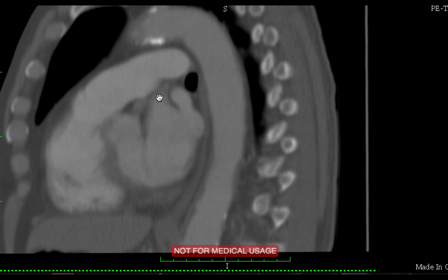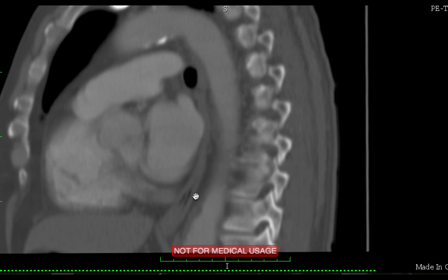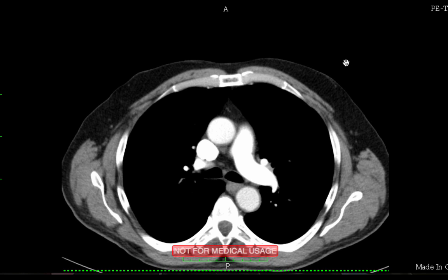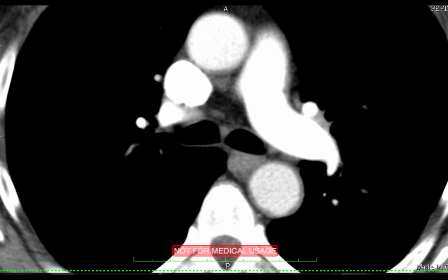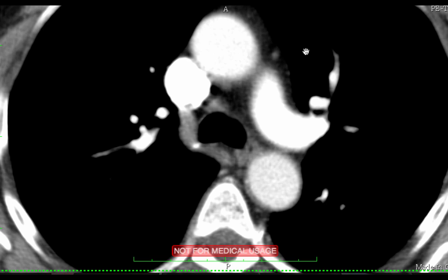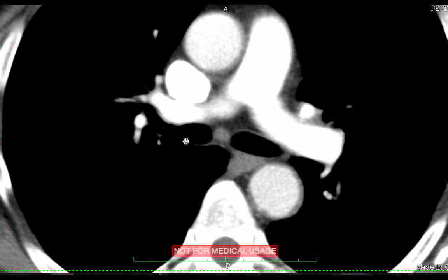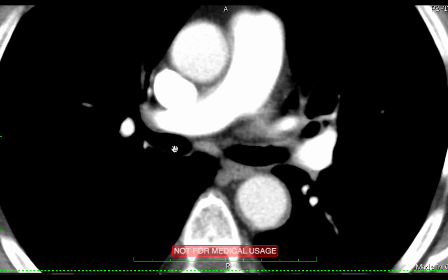SVC. Esophagus. That's a nice view of the esophagus. Very nice. You see the air stripes in here, so you know this is the esophagus. Well, I hope that gives you a little bit better an orientation about what you've got when you're looking at the mediastinum. It all makes sense. These other little tiny things, like this is probably a little lymph node. This is the arch of the azygous vein. We'll discuss that another time. So let me know if you have any questions.